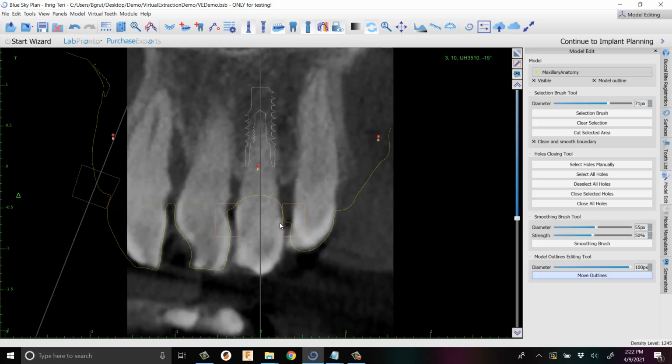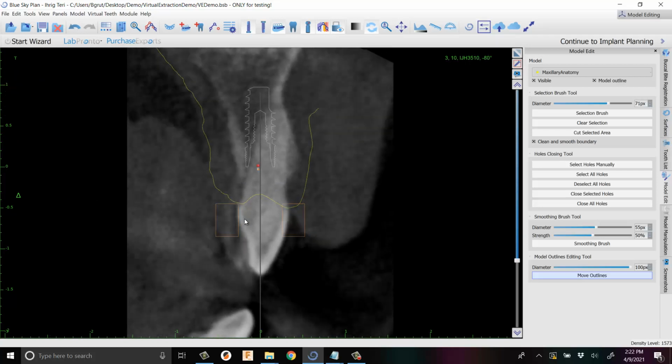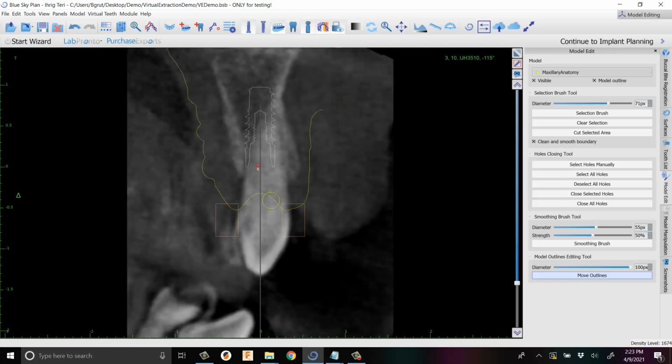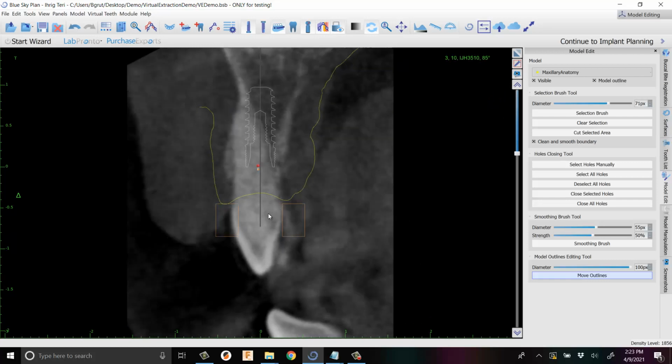Okay. Now I have to rotate to show it from the buccal lingual and do the same thing. You can go up as high as you want and just keep kind of rotating and adjusting as you see fit. Try not to make any sharp bends to it because that's going to create those little dimples that are kind of just silly on the resulting model. And I just sort of spin around it and adjust, and just maybe spin around it twice just to make sure everywhere is below it.